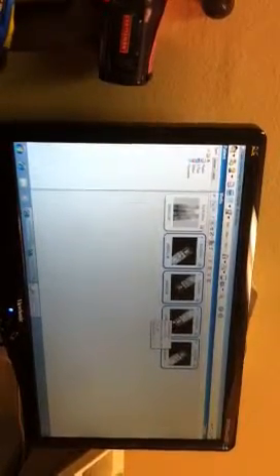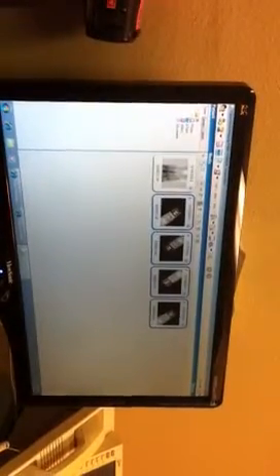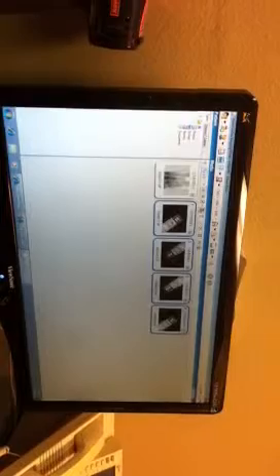Remember, look at the size. It's 2.3 megabytes. We don't compress the images. Many other software compress the images, and you lose quality when you do that. We leave them full size. You have a brand new server with a lot of storage. You're not going to run out of space. These days, that doesn't happen. Okay, so any questions on these buttons?